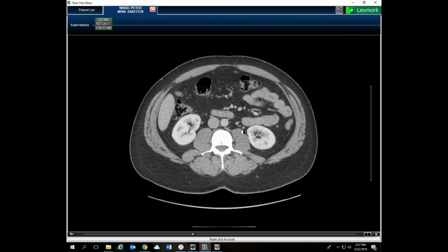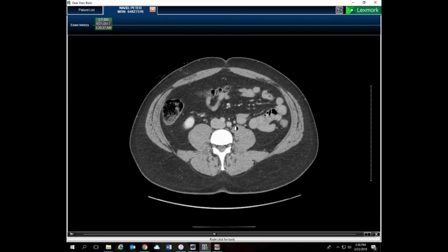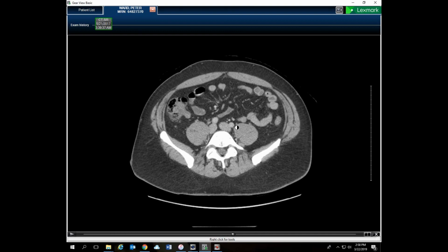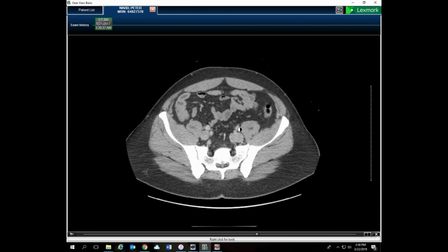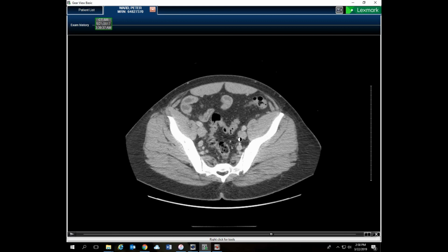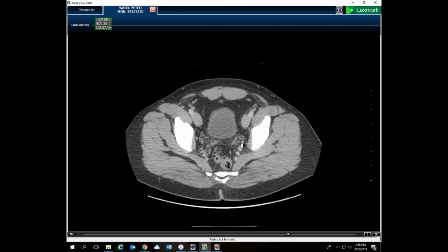We're going to follow it down into the pelvis, and it's a little tough to keep it straight from all the other gray stuff that's nearby, but it's traveling on the anterior portion of the psoas major muscle. We travel a little further down, and it's going to be medial as we pass further into the pelvis. So it's still medial, it's still posterior. It's going across the iliac vessels, descends fairly posteriorly, and now we're about to start seeing my urinary bladder, and it's going to transition in this way. But look right there.